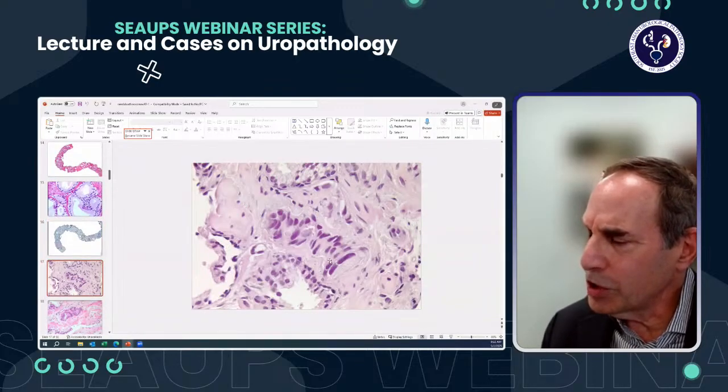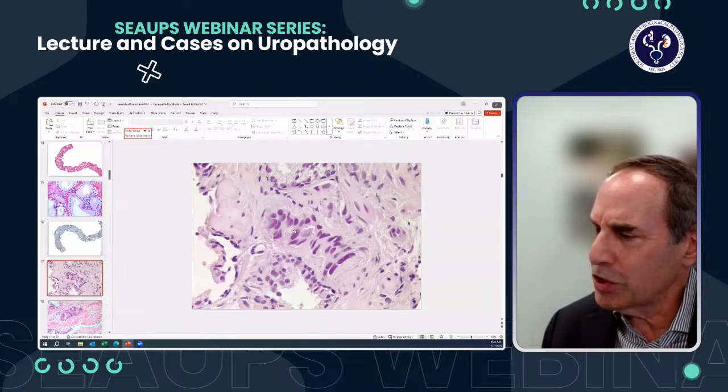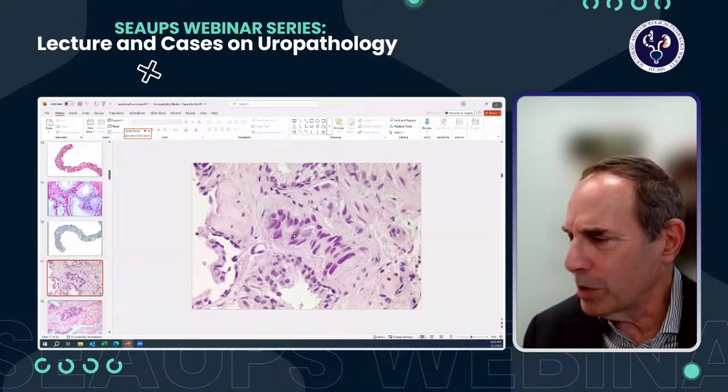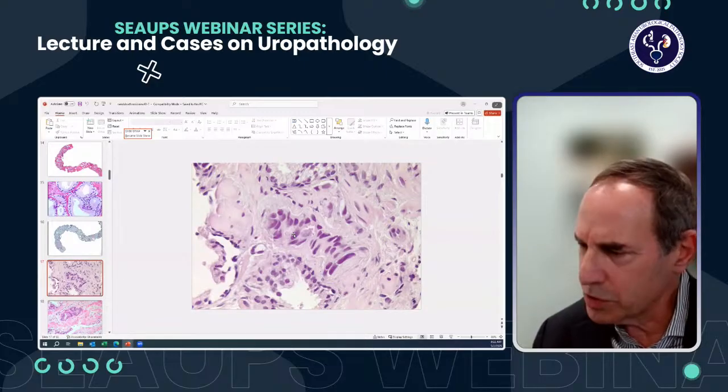Now, if we turn to nuclear features, we mentioned nucleoli, apoptosis, mitotic figures, but nuclear hyperchromasia in large dark nuclei is also very useful in diagnosing cancer. So even in the absence of prominent nucleoli, if the nuclei look dark and enlarged, that can help diagnose cancer.